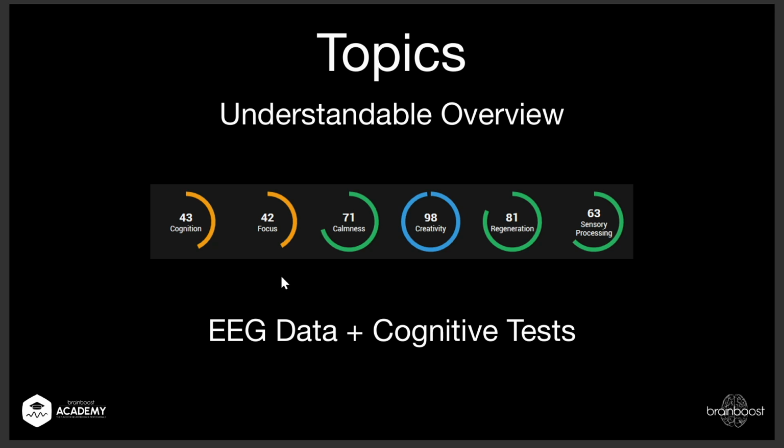Maybe your EEG data is not super perfect, but some people can make up for that by performing under pressure. They have a good sense of when they need to perform. The brain really turns up. And so maybe the focus is not completely bad. This is why we combined EEG data with cognitive tests, to really cover multiple sides of topics, so you don't just say, oh yeah, today you had a lot of theta, so bad for you.